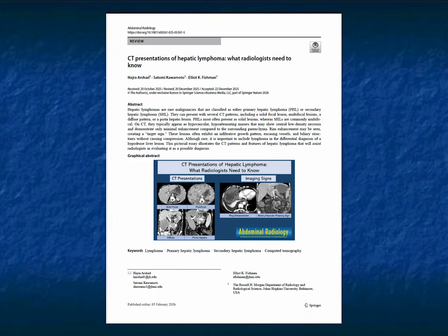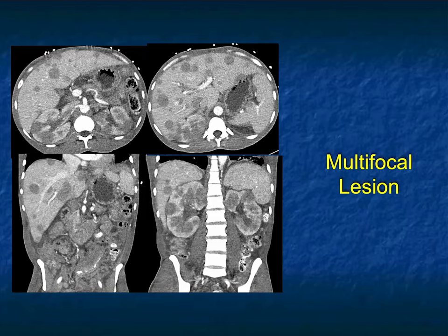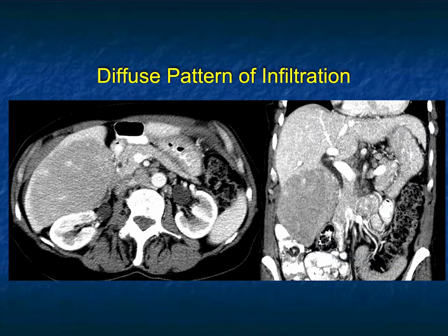So in this article, we spoke about multiple patterns of hepatic lymphoma, and let me go through them one more time. Solitary lesions, common particularly in primary hepatic lymphoma. You can see nodes in the porta hepatis here. Multifocal disease, both kidney and liver, so it's beyond multifocal. But if it was the liver only, you would have said metastatic disease, like maybe metastatic colon. When you have the kidney involvement, solid masses in the kidney and liver, I don't see anything obvious in the spleen, maybe tiny lesions. But then it pushes me to saying lymphoma, which this indeed was.